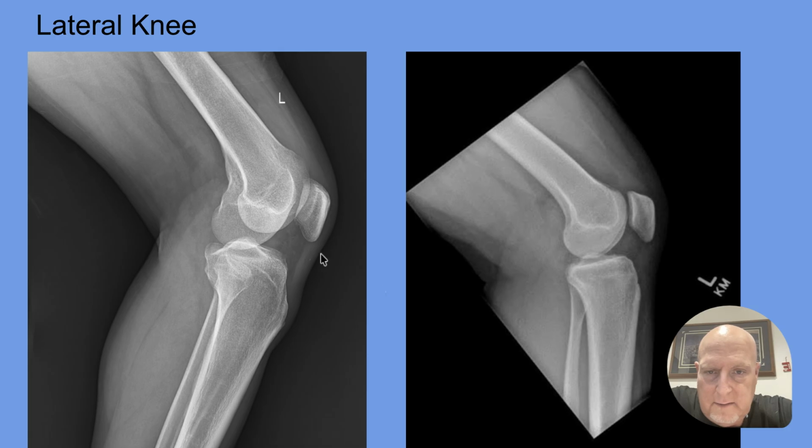Anyway, we do have a little bit of superimposition of the underside of the patella here as well. Here we have a nice joint space. Pay attention to the rotation of your knees, and you'll get good at it, I promise.